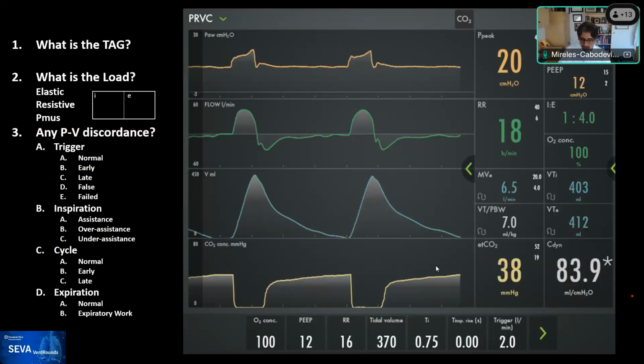So this one, we're just going to skip directly to the meet. It's mid-June, sorry. And the goal is to start reading this waveform from the get-go. And I put every single part of the data that we have on this patient. This is an active patient that we have currently.